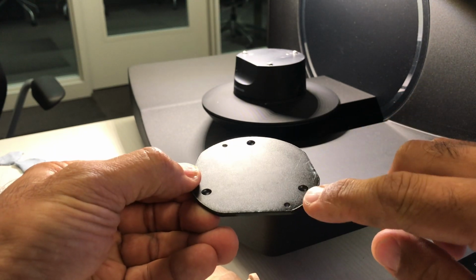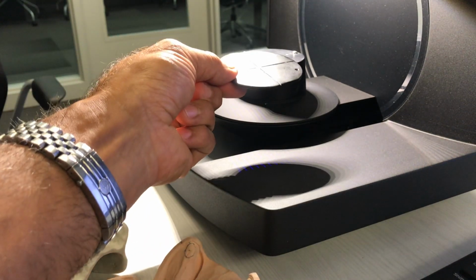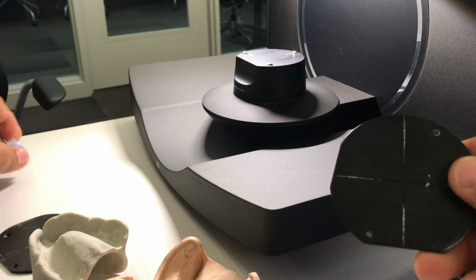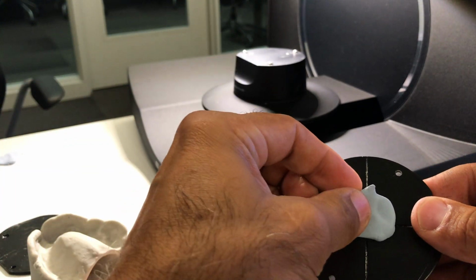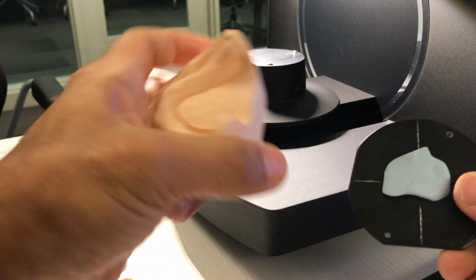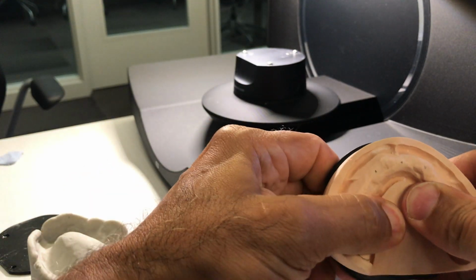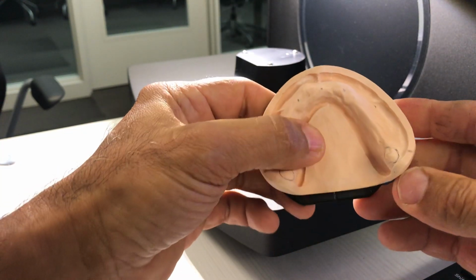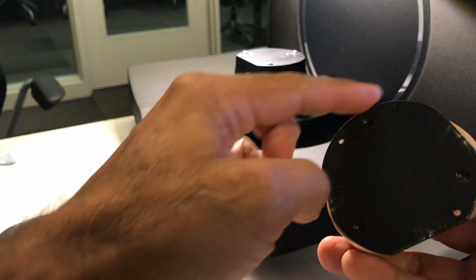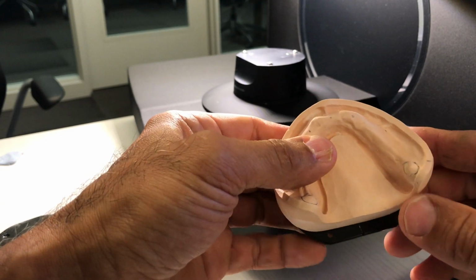And you can see the little concavities on the underside of the plate, and that will correspond with a scanner. So what we need to do is secure our lower model by using this little putty. I'm going to take my lower model and just firmly press it up against the plate. Notice that the back side of the plate is flat, whereas everything else is kind of round. So the flat side of the plate corresponds with the back side of the model, very simple.